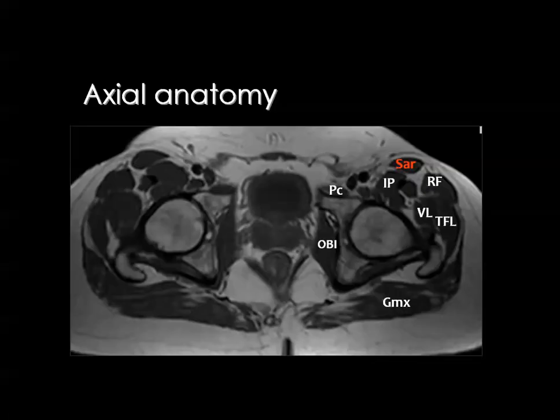Then we would explain some of the anatomic details around the hip joint, but they are not essential to be memorized. Only whenever you are confronted by a lesion which affects one or more of the muscles around the hip, just open the book and look for the name of the muscle. And I would like to show some of the important muscles so that you are able to make an easier report.